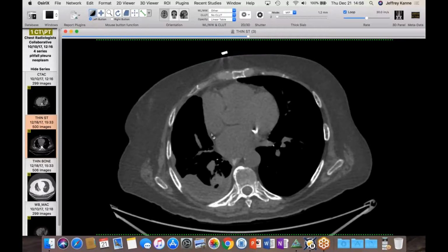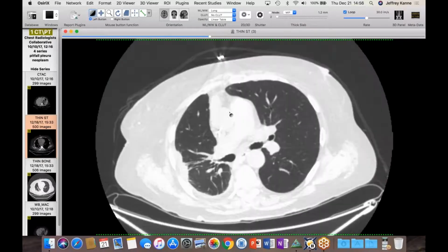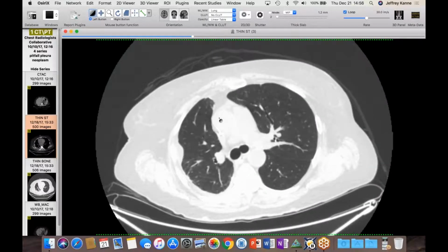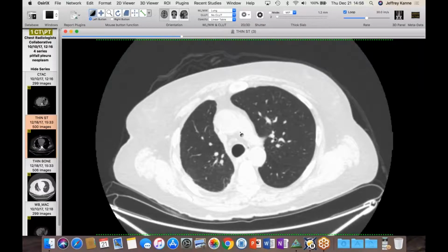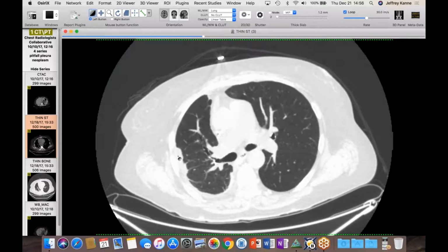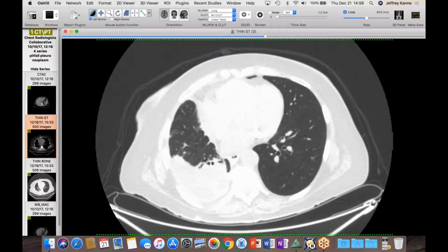And then you see the nodularity along the pleural surface too, along the mediastinal pleura, which is not typically a good sign. We don't like to see that in the setting of benign pleural disease, and this sort of lumpy, bumpy stuff too. But I don't know, when you guys see a rounded atelectasis, there have always been reports and people have mentioned they've seen one here and there, but how often do you just say it's rounded atelectasis and be done with it versus do additional workup?